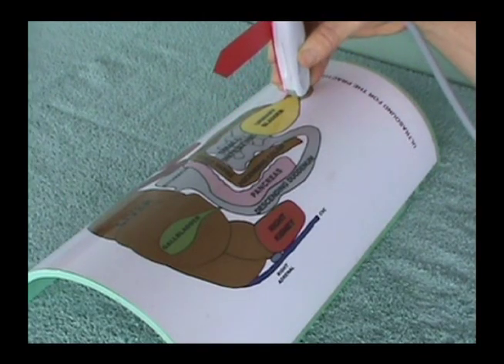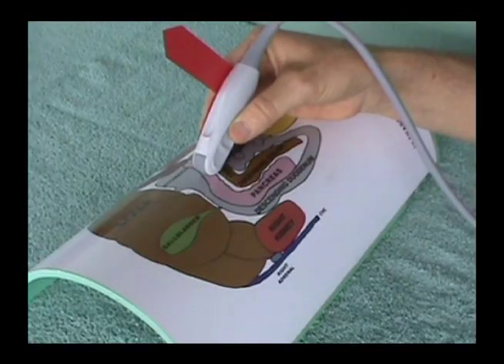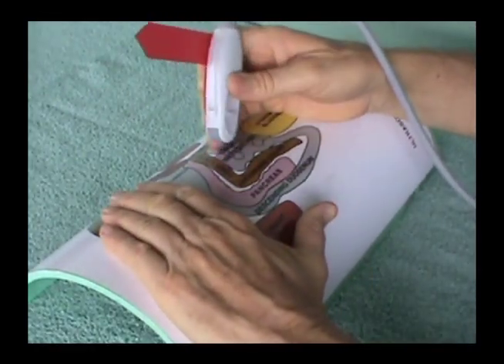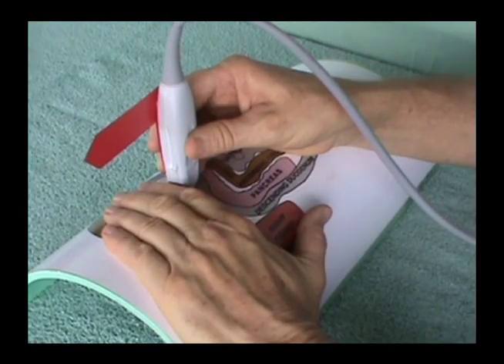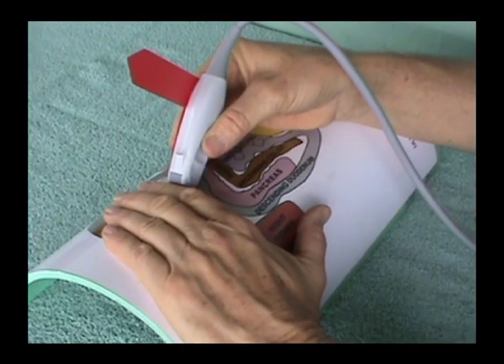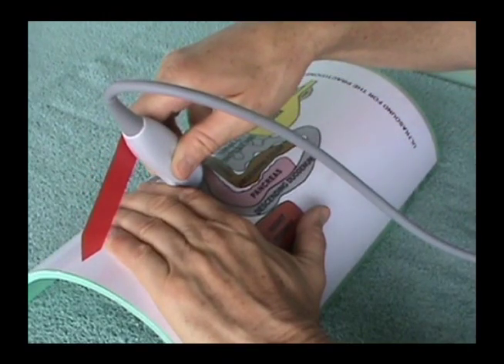From the sagittal position, when you angle cranially, note that it is the ultrasound beam that moves cranially. Place your free hand over most of the liver and gallbladder of your abdominal graphic to simulate the rib cage. Place your transducer over the cranial stomach and angle cranially under the ribs to see the liver. Note, if you angle caudally, it is the ultrasound beam that moves caudally, so that you can see structures caudal to the stomach.